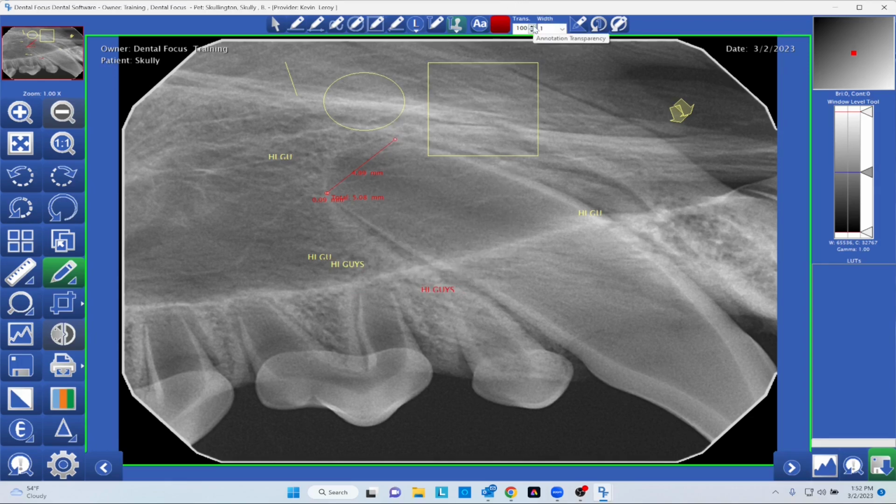And we can also adjust the transparencies, line widths, and quality of those annotations, much like most Word documents and things like that. We can also choose to show or hide these annotations. When we are finished, we can deselect them, select the annotations at hand, and then deselect them as well. Deselecting our annotations button, our tools will go away.